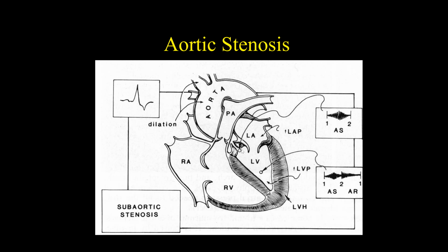And then we get also, because of this, again, you put your finger over the end of the garden hose, you get this high jet velocity. Typically, these dogs will get dilation or prominence of the ascending portion of the aorta. So notice that this ascending portion of the aorta is wider than the descending portion of the aorta.